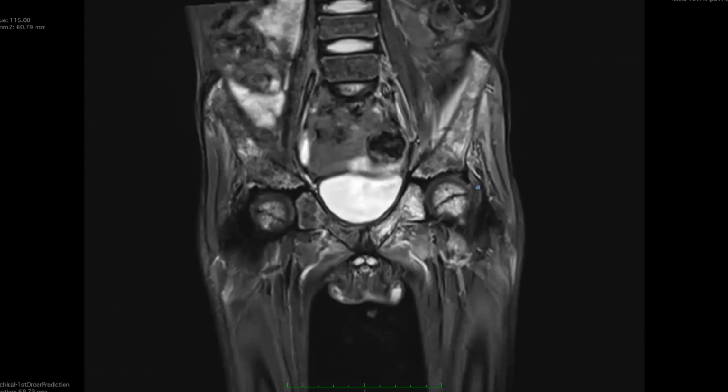So far, what am I thinking in terms of? A diffuse infiltrative kind of process. At this young age, it could be leukemia-related infiltration. It could be some systemic infection or metastatic disease from neuroblastoma, etc. But for 11 years, neuroblastoma is slightly old. So in this, some kind of general systemic process is what I'm thinking along the lines of.